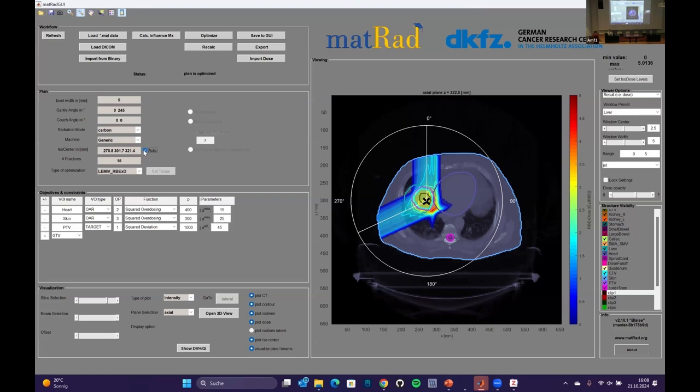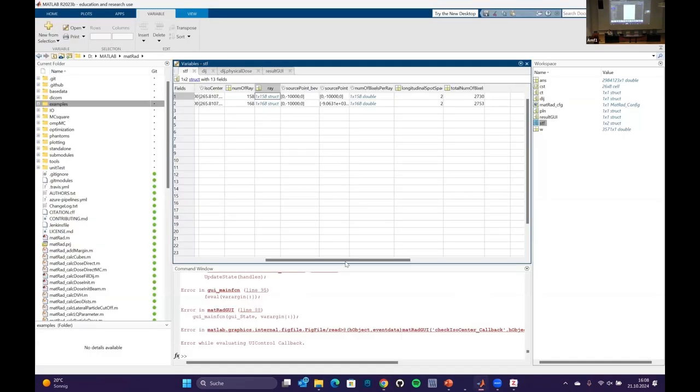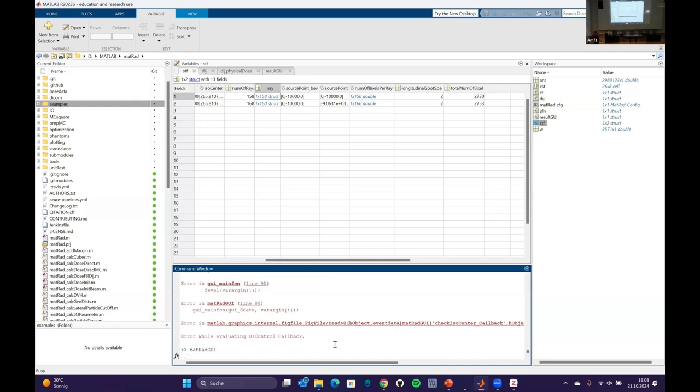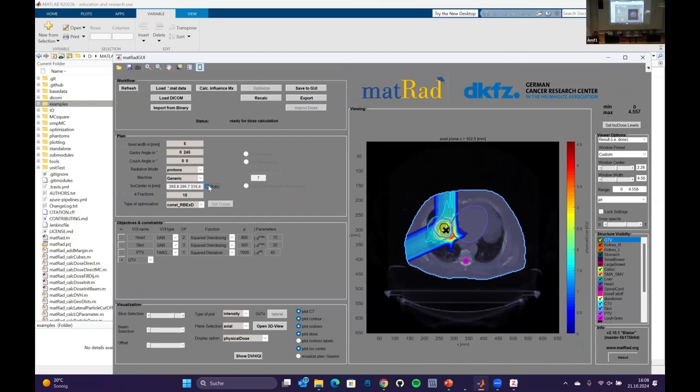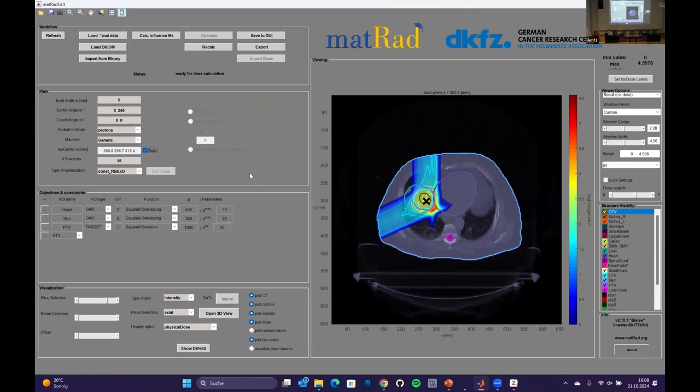I don't know, something is broken in the background. I will probably just restart quickly. Let's just try to load again. Now it worked. I don't know why it didn't work before. I hope it works for you. If not, just restart quickly.